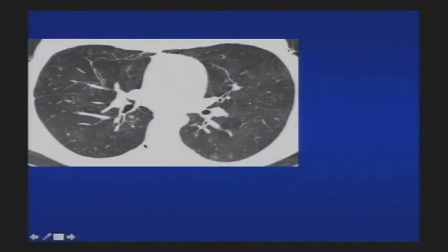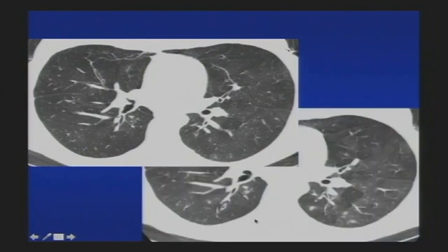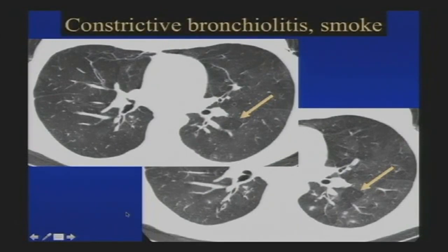Here's a beautiful one right here. Notice that's like a few lobules that are just knocked out of the lung. Looks lucent. There's the expiration. Notice how in the expiration the lucent lung stays lucent, and all this normal lung becomes more opaque. So that just confirms that the lucent lung is abnormal on the inspiration. It's the isolated finding. I'm going to diff this out as bronchiolitis obliterans, asthma, and hypersensitivity. This patient had constrictor bronchiolitis due to smoke inhalation in a fire.